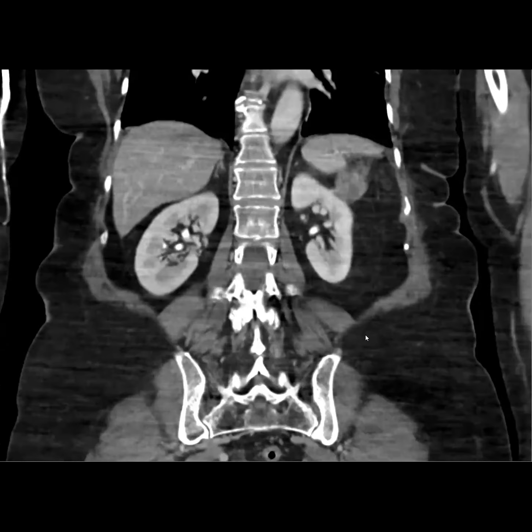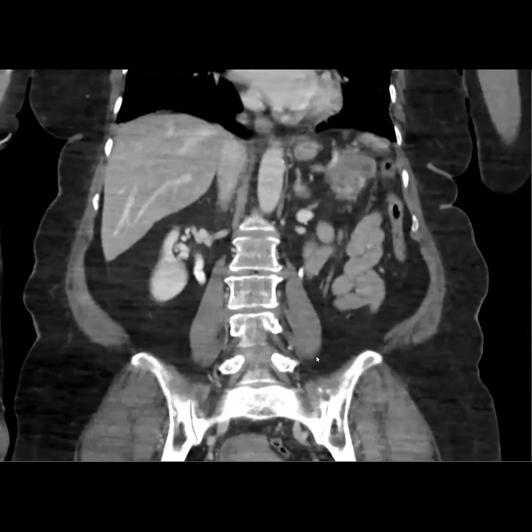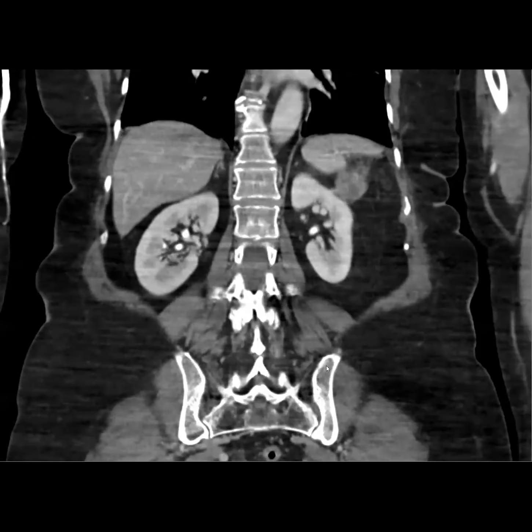So we're thinking either necrotic adeno, an acinar cell, or a fluid collection from pancreatitis. It looks pretty malignant. IPMN, good thought, and maybe even with malignant degeneration. It looks like there may be some soft tissue components. Any other thoughts?